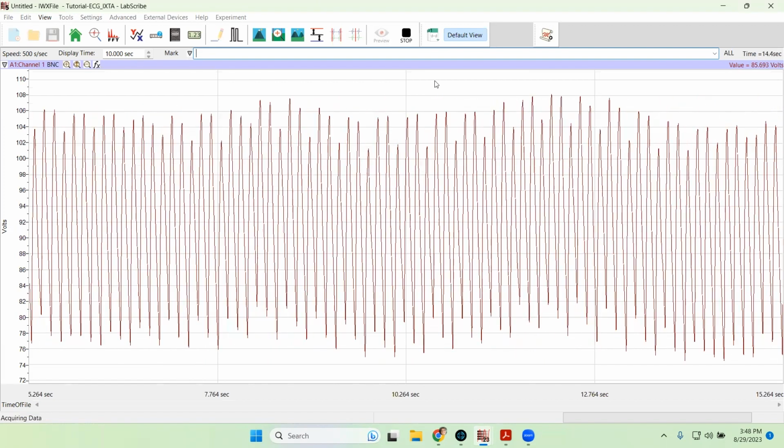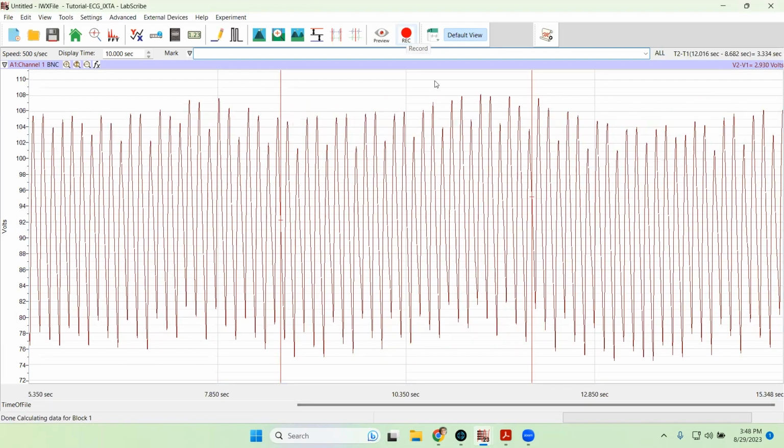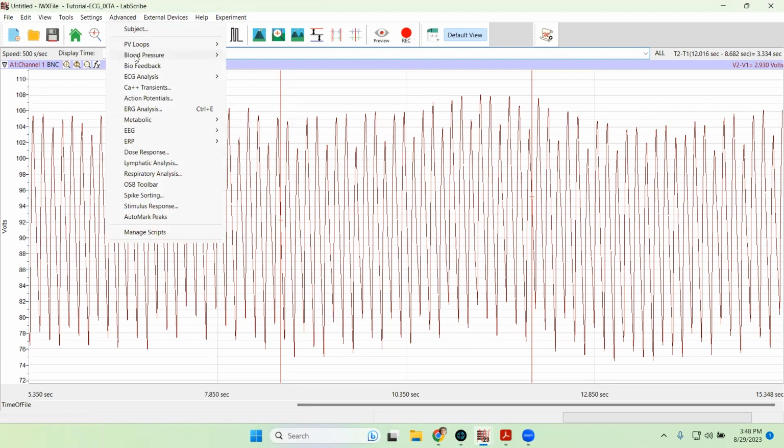So as I was saying, sometimes it's of interest for the researcher to want to do online measurements, meaning they want to keep track of certain parameters while the animal is anesthetized and they manipulate factors such as adding a drug or stimulating a nerve or a muscle. So we offer 8 online toolbars, they're called. Each of these toolbars will show a separate tab up on the top, which will follow different parameters, which means you're able to get or show parameters real time from 8 different sensors at one time.